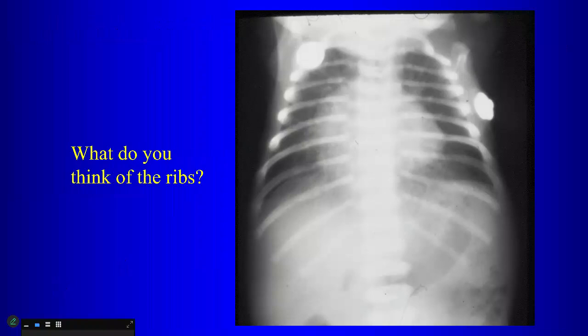How does that help you? What do you notice about the ribs here? Well, how many ribs are there? 11 ribs. So how is that important?